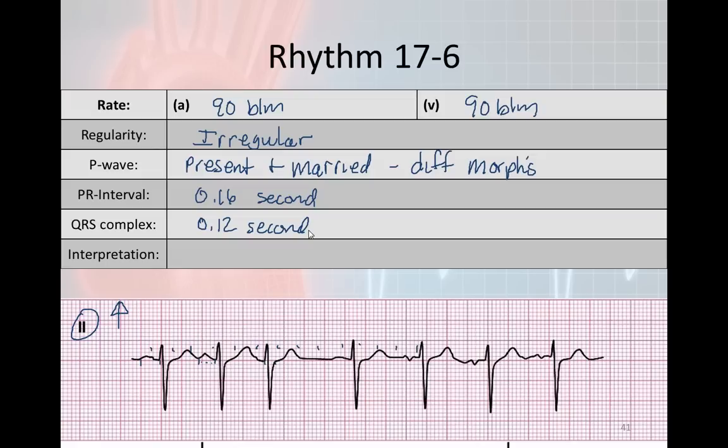We'd have to do a 12 lead to confirm that. Interpretation, what problems do we have up here? We have different morphologies. So let's find out how many we have. We have one morphology here. Do I see that morphology again? That might be a 1. I'm not really sure, so we'll go ahead and say a 1. Here's a 2 right here, kind of a peaking. Do we have another peaking? It doesn't look like we do.